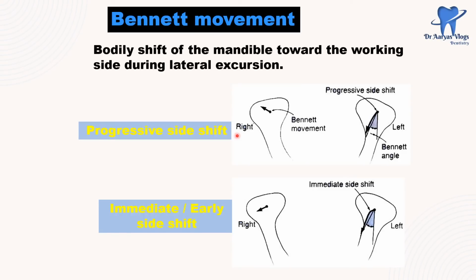And coming to the Bennett movement. Bennett movement is the bodily shift of the mandible toward the working side during the lateral excursion. This is the progressive side shift and this is the immediate or early side shift.